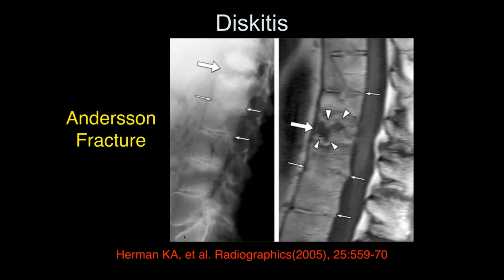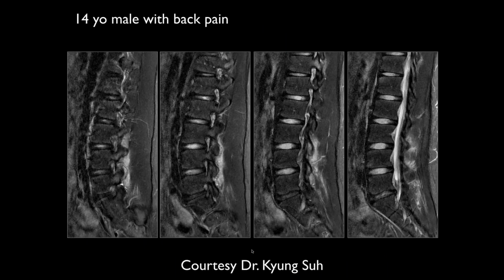Okay. And then here are areas of discitis where you're really getting destruction of the end plates, which is also a more prominent form of Andersson disease if it's due to inflammatory changes.